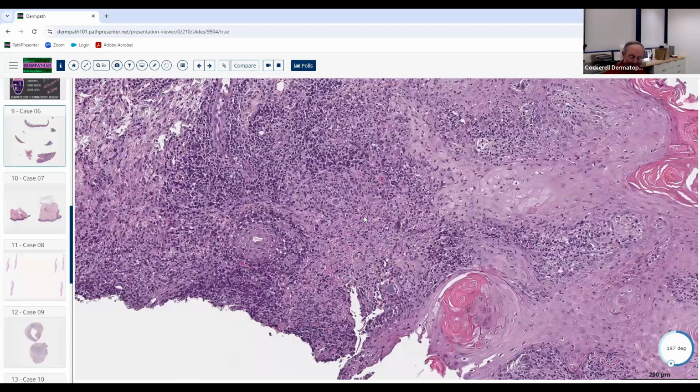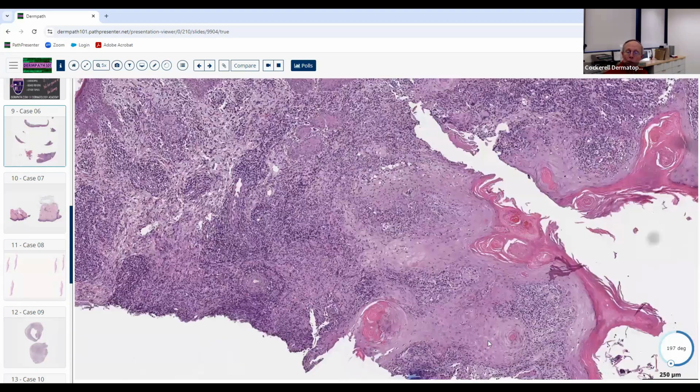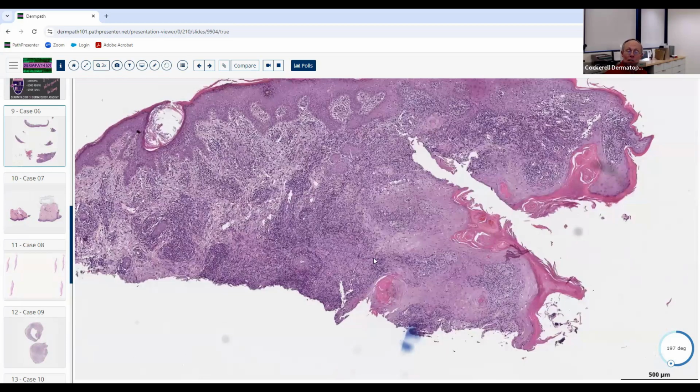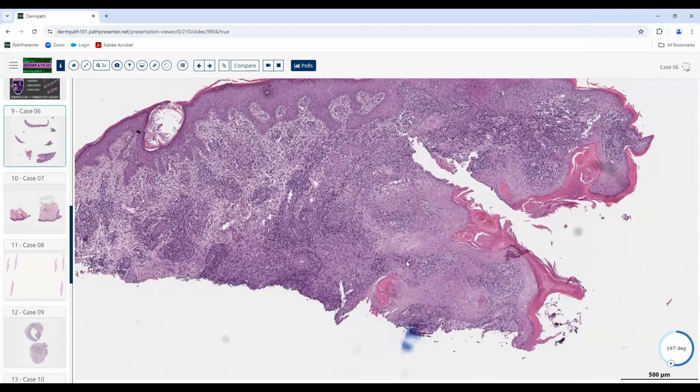Infectious diseases. Yes, infectious disease. The most common is a ruptured cyst or ruptured folliculitis. But we always want to be concerned about an infection when we see that pattern, especially when it's a diffuse nodular pattern. And we have this change, which is called what? Pseudoepitheliomatous hyperplasia. Yes. If you see this, I want you to instantly have a reflex that says this could be infectious disease. And Dr. Rosen wants you to think that way also, by the way.